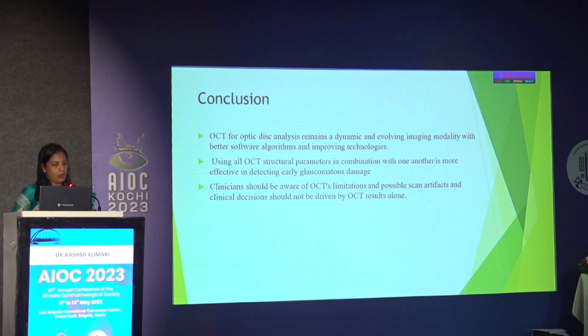So in conclusion, I could say OCT for optic disc analysis remains a dynamic and evolving imaging modality with better introduction of software algorithms, and using all structural parameters in combination with one another is most effective. And clinicians should be aware of OCT limitations and possible scan artifacts, and clinical decisions should not be driven by OCT results alone. Thank you so much.